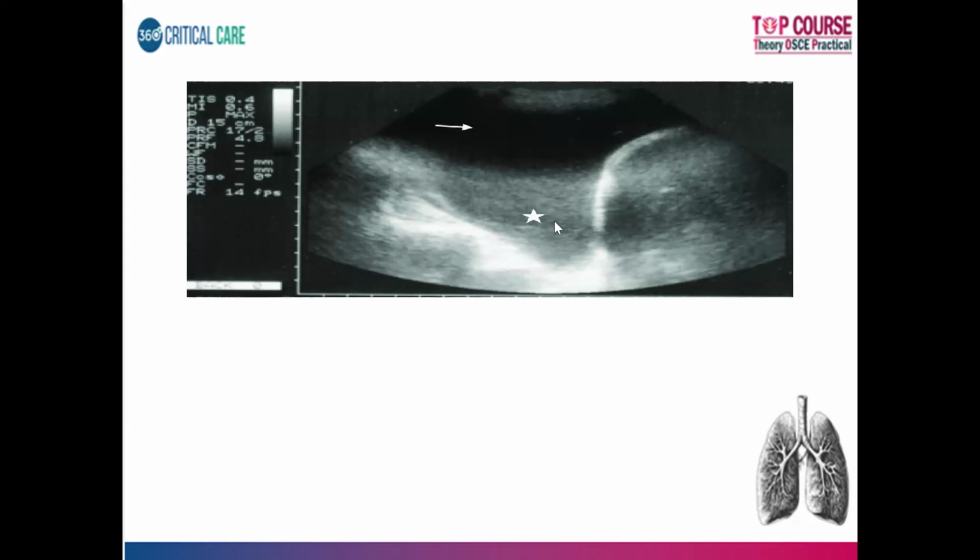Come on, guys. What is that sign called? There are a lot of signs. Okay, we'll be ending up lung ultrasound soon, and then we'll be going over the other parts of lung ultrasound quickly.